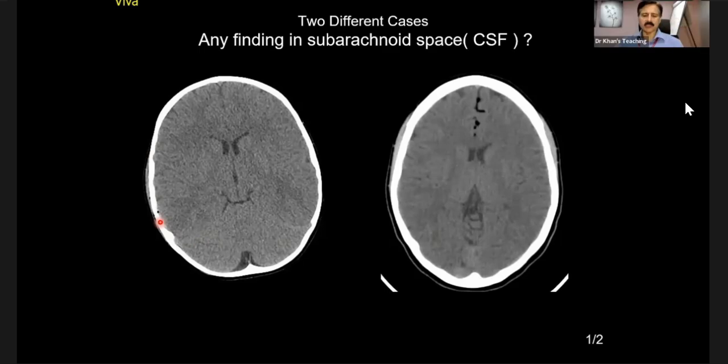My question is more basic than that. So you are absolutely right, you will go for a bone window, and you will look for an associated fracture. If you see here, there is a hypodensity. What is this hypodensity? It's most likely air. How can you confirm this? Okay, what is this hypodensity? It's again most likely air, but fat can again have the same kind of appearance.